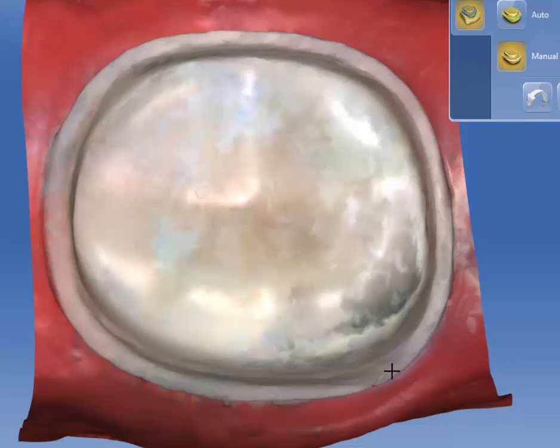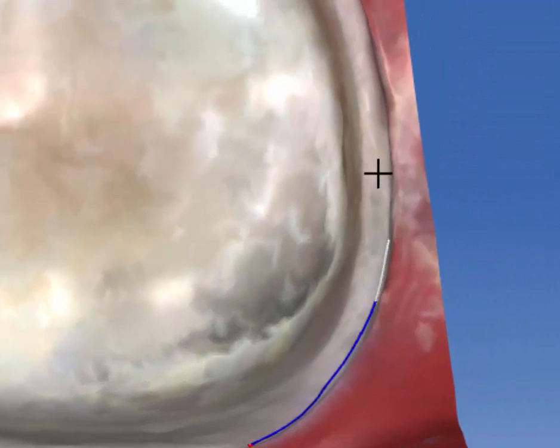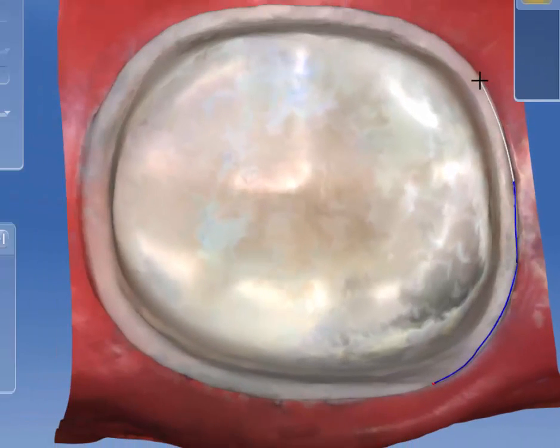And now what I normally do is pull the cursor up and then just bring it back and lay it on the margin. So I bring it until I can't go any farther. And as you can see, I'm trying to curve this. And I just fell off. I'm going to leave it just so you can see that.